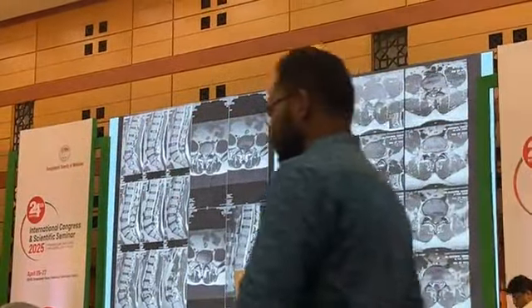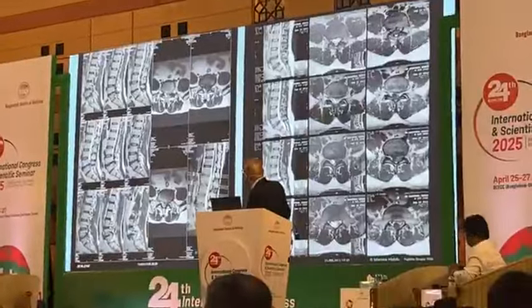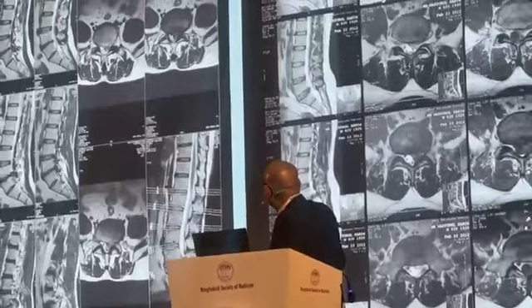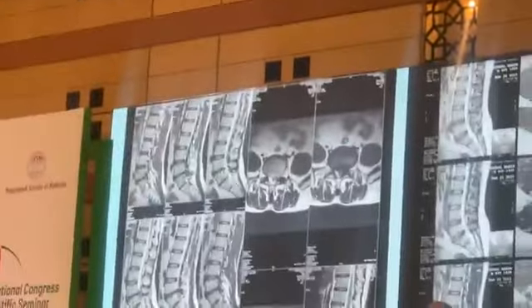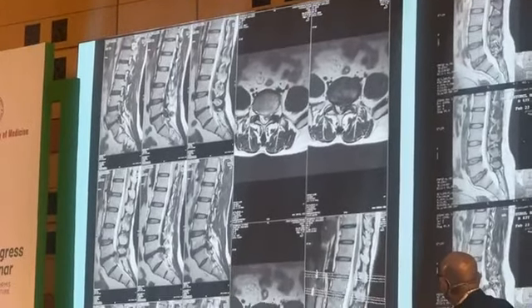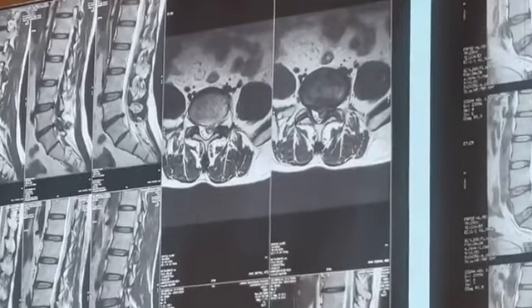And it's not very academic MRI, but just to show you, this is L5 and this is S1 vertebra, and we see a disc between L5 and S1 that has prolapsed into the spinal canal. And in axial section, we see the disc has come from the left side.